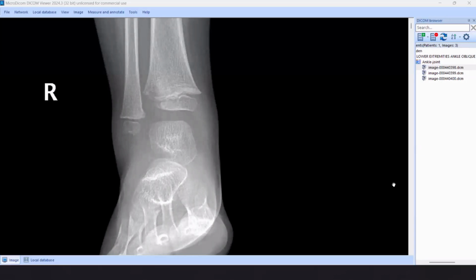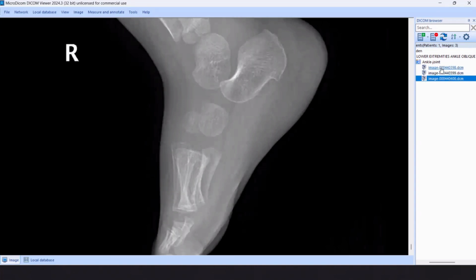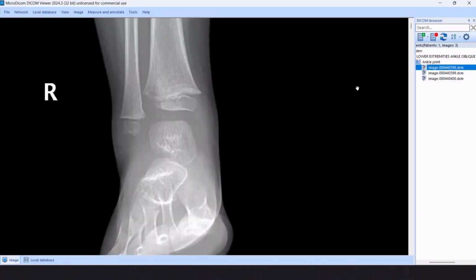And I think it's going through the physis as well. There's some sort of soft tissue swelling at the ankle, at the level of the ankle joint. No bone lesion, no other acute bone injury. So I think this is a fracture.